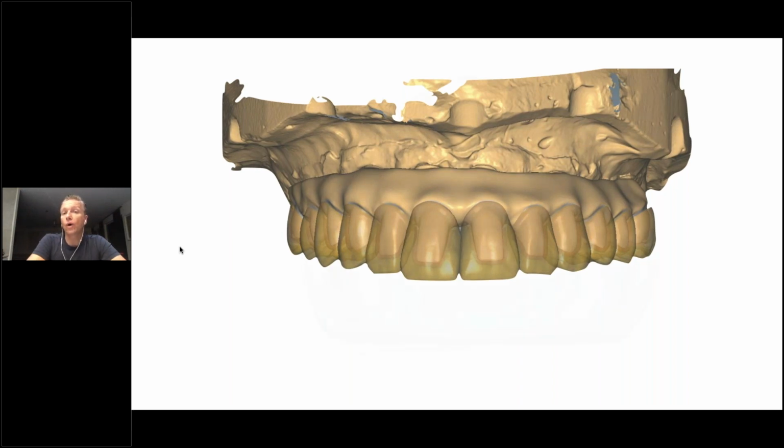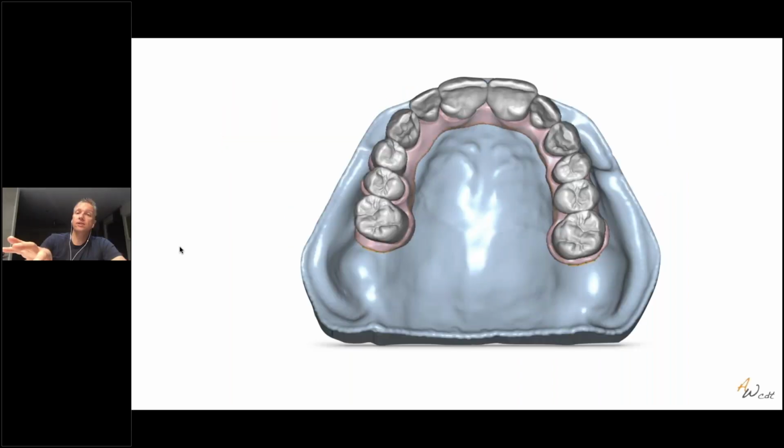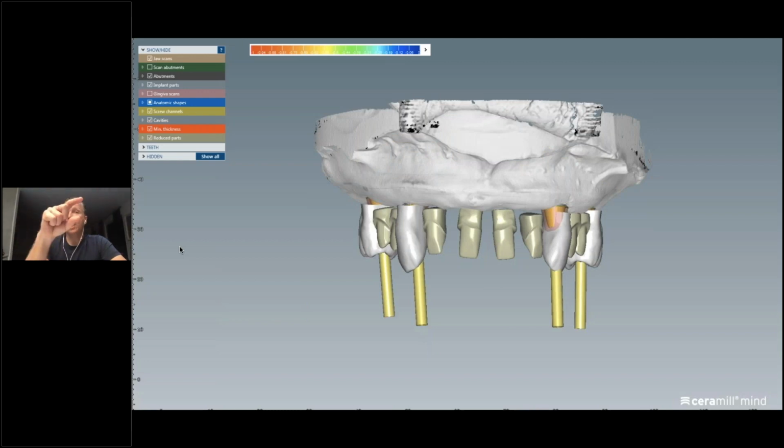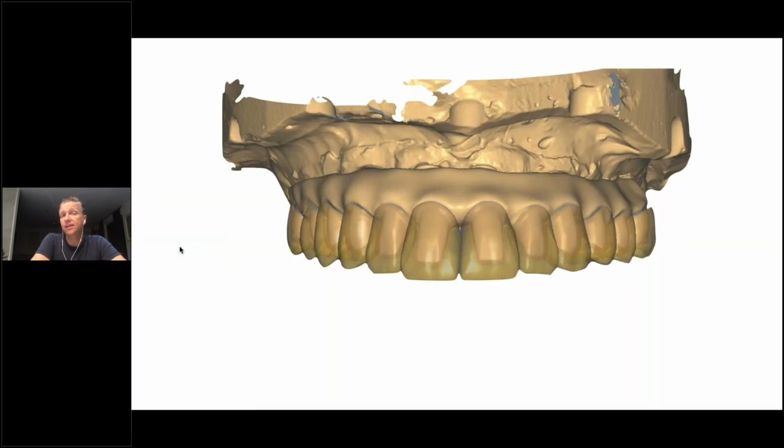Or if I do not want to do the thimbles, by the way, the thimble module allows me now, after definement of that, after finish, to actually do the secondary construction with other crowns. So this here basically I can then design straight the crowns, so I can fabricate both at the same time.